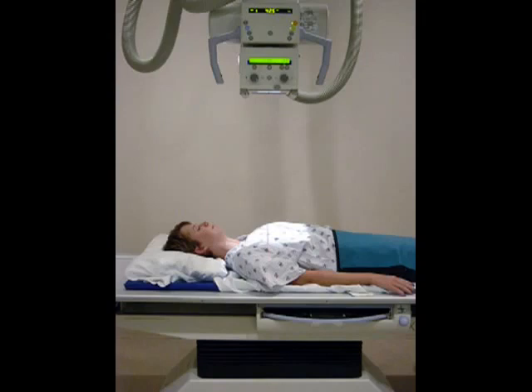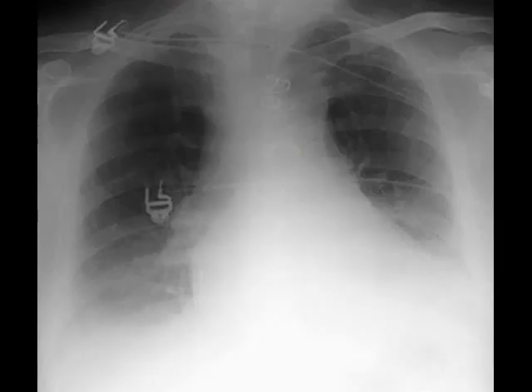More common for respiratory therapists to see is what's called the AP chest, or anterior to posterior chest. This is the type commonly done on those patients that can't leave the ICU to go to the x-ray department for their chest film. It's done with a portable machine which is pushed into the patient's room. And here's an image shot by the AP technique, a portable chest x-ray. Not as good as the PA, is it?